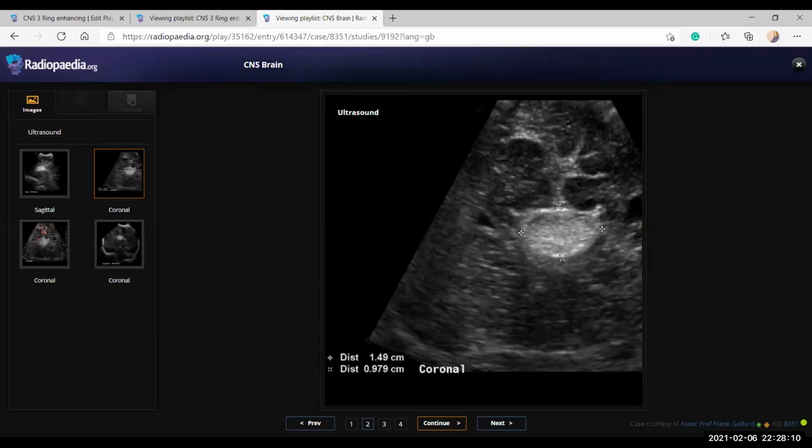the supratentorial and suprasellar region, I mean. This is the both lateral ventricle. Yes. What is this? This is the ventricle, both lateral ventricle. So this is an echogenic mass. If this is a preterm neonate, but I think this is a mass, not a sign of germinal matrix hemorrhage. This could be just a mass lesion with echogenicity, could be a lipomatous mass or lipoma.